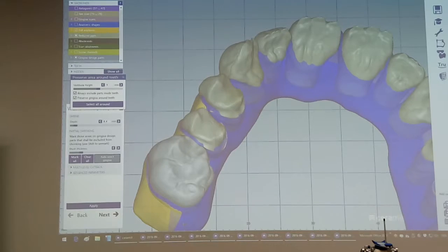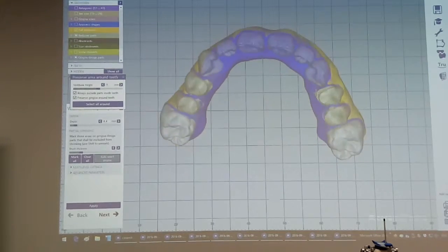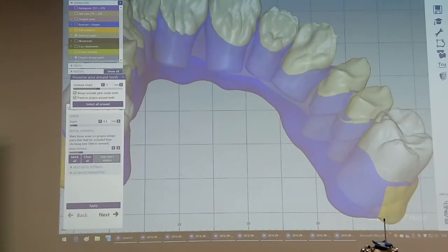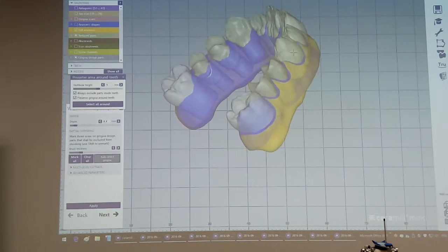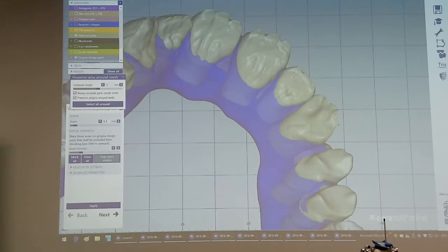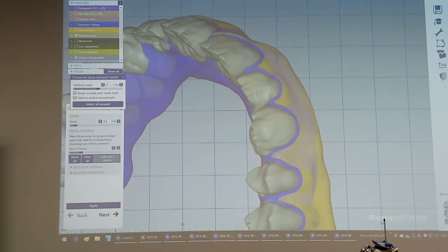So, it's the same what we have done before. We will cover the premolars with ceramic, and the canines, they get a stable palatinum side in zirconium, and only the buccal side will be laminated with ceramic, and the incisals, they will be laminated from the incisal guideline here. This is done out of zirconium, and from here on you can see the small angulation here will be covered with the labial side to the front.